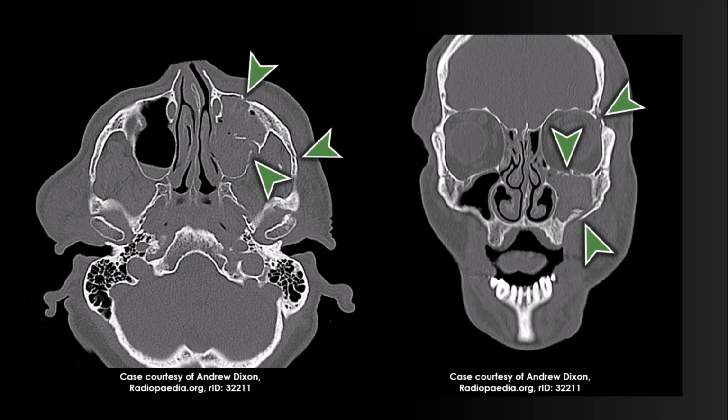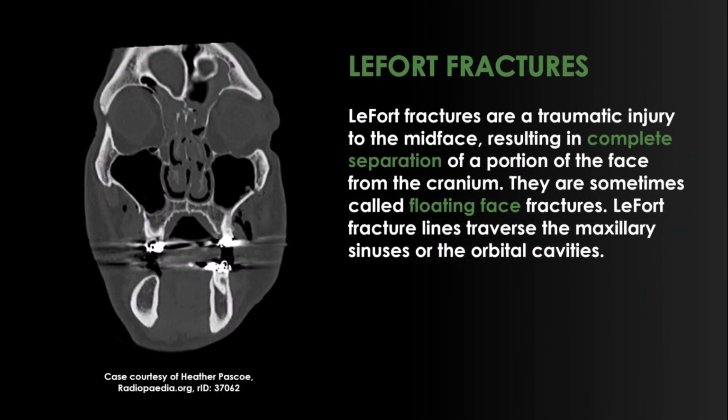The next type of fracture is also caused by trauma. This is a class of fractures called LeFort fractures. LeFort fractures are a traumatic injury to the mid-face, resulting in complete separation of a portion of the face from the cranium. They are sometimes called floating face fractures.